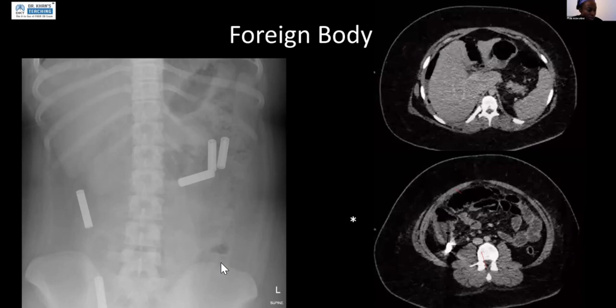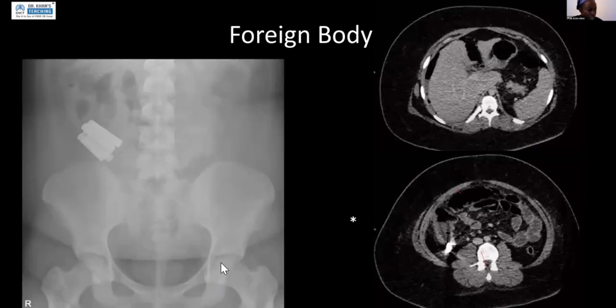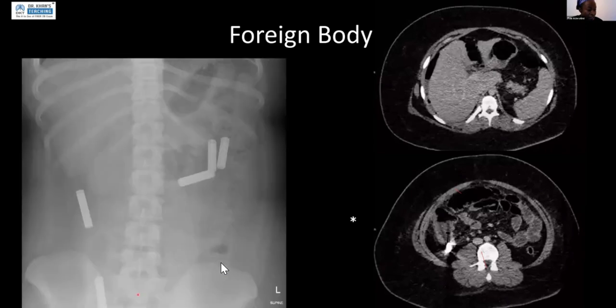And then on her subsequent radiograph, things had moved on. We actually found out there were 5, because the 4 were obscuring the 5th battery. One had progressed into the ascending colon and 3 were in the transverse colon, but 1 stayed within that right iliac fossa and looked like it was more inferior than it had been on the prior radiograph. If I just flick back for you.